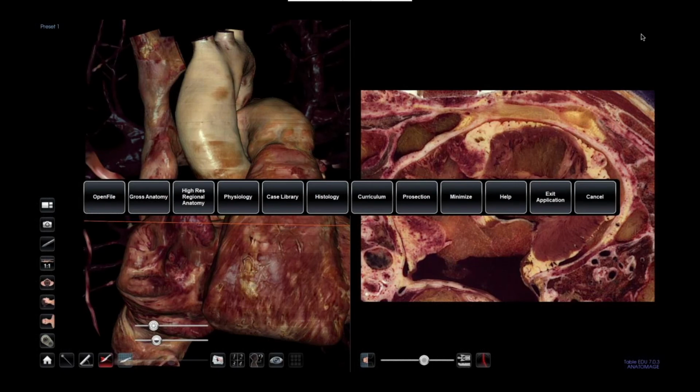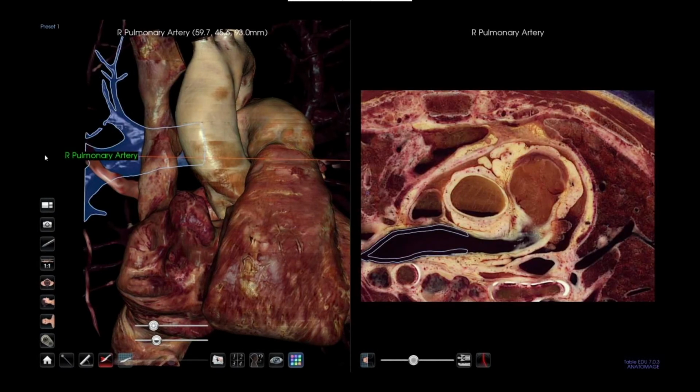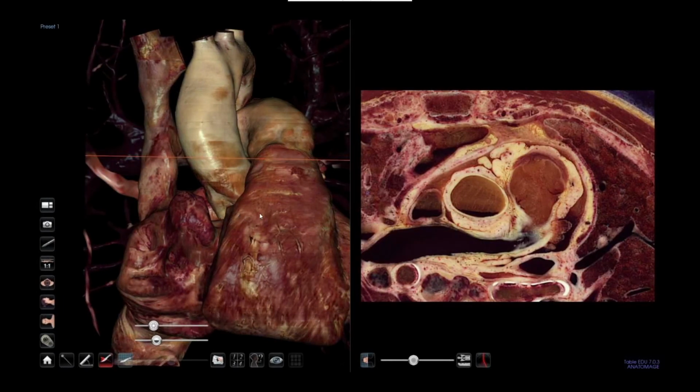Once opened, this is not the default visualization, but I did another step. By opening the layout icon, I selected the second option that lets you compare the 3D visualization on the left part of the screen with the 2D visualization and the 2D original images on the right part of the screen.